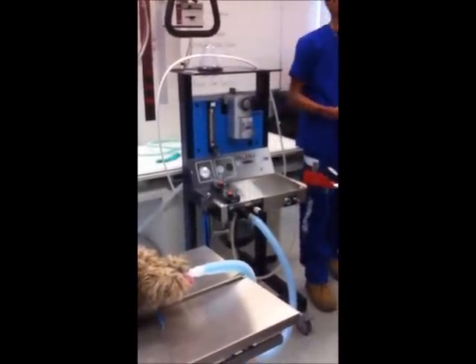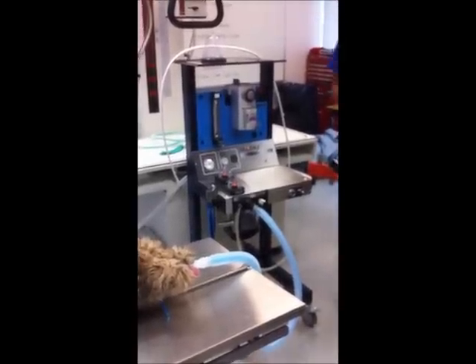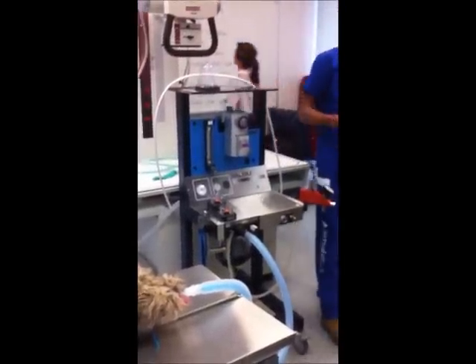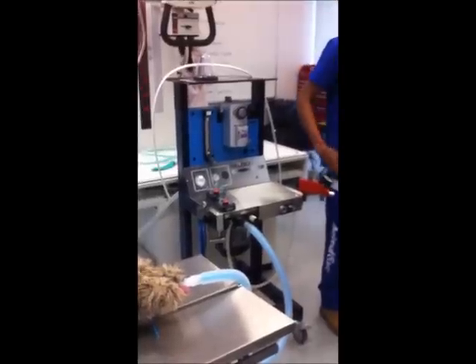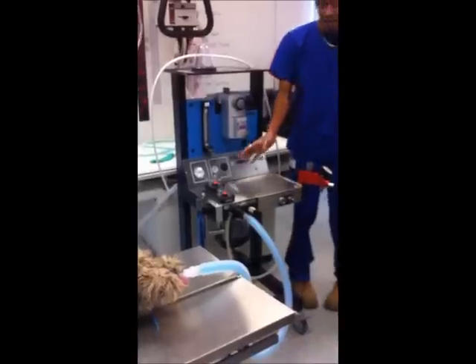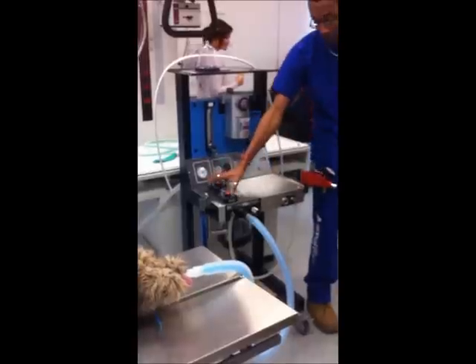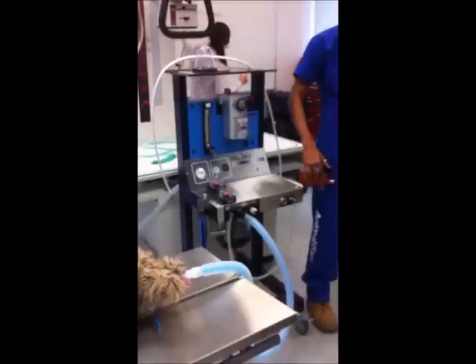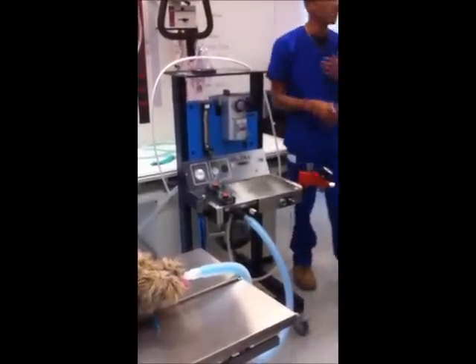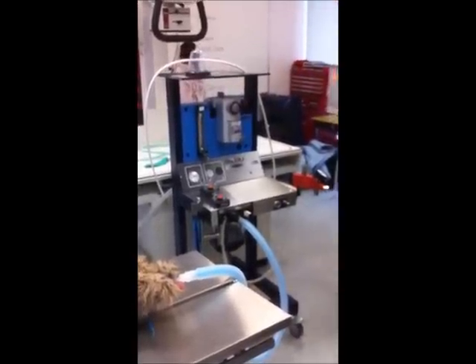What's the next stop after that? The canister. What canister? The soda lime canister. What happens in your soda lime canister? It absorbs the carbon dioxide. Why is this important? We don't want it going back into the blood. Good. Some of this gas is reused. Remember, this is cost-friendly, a lot cheaper, because a lot less gas is used in the rebreathing system compared to the non-rebreathing system. With carbon dioxide filtered out, you can reuse some of that gas, but you will still have waste gas and some of that will be leading out of the system.